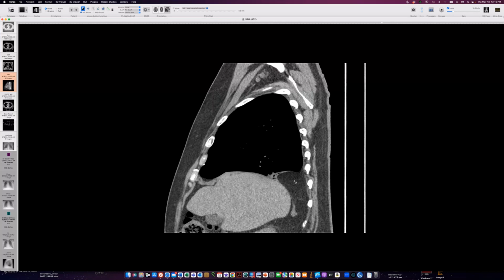No, I think it's contained outside. I mean, you show a nice continuity with the upper abdomen there. But what's containing it? What's the membrane over it? Because there's no peritoneum back here. These Bochdalek-like hernias that arise medially like that, it's perinephric fat. We don't have peritoneum. Right, it's not a hernia sac. No, I guess you've got the parietal pleura sitting on top of it, but you wonder also, I don't know, maybe I'm trying to think if there's any tissue in there.